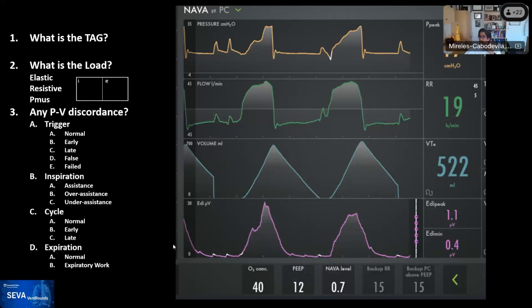and the goal here is for you to take a look at this image, and it will help us. There's a fair amount of information going on in this image, so we'll dissect it little by little. So to start, if any of our audience wants to talk about or put in what's the tag for this mode.